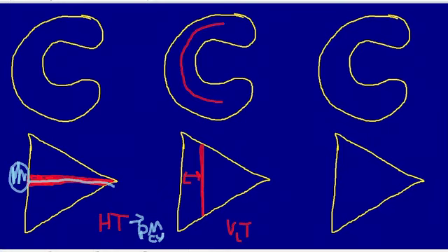Even though I can't draw it completely appropriately, it always stays the same distance from the outer margin of the medial meniscus. One thing you'll notice is that the tear never contacts the inner surface of the meniscus. It always stays somewhat peripheral. So these are the hallmark findings of a vertical tear: it's longitudinally oriented, running from top to bottom, vertically oriented, and it never contacts the inner surface of the meniscus.